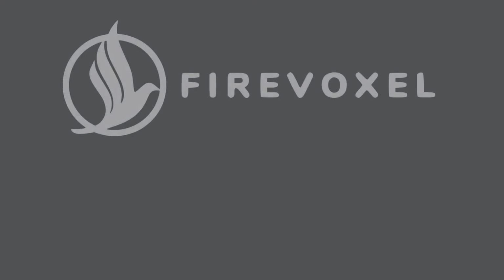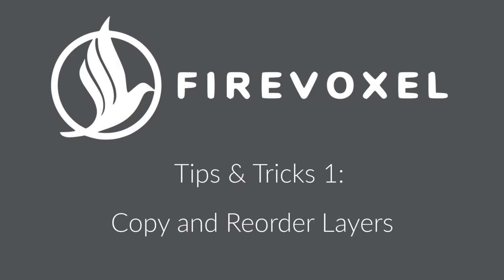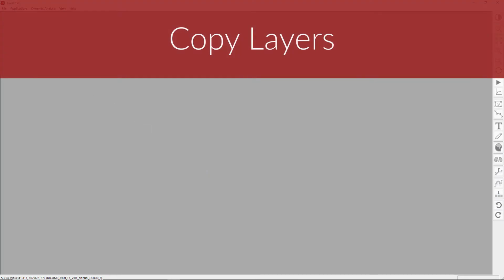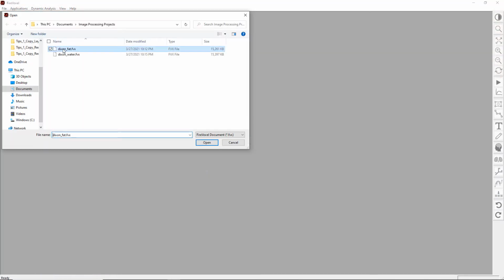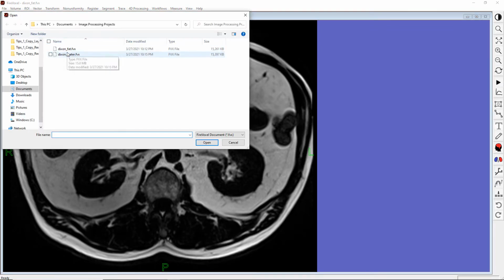Hello! In this installment of FireVoxel tips and tricks, we will show you how to copy layers between two compatible documents and reorder layers in a document. We will start by loading two three-dimensional abdominal Dixon images, fat image and water image, from the same acquisition.